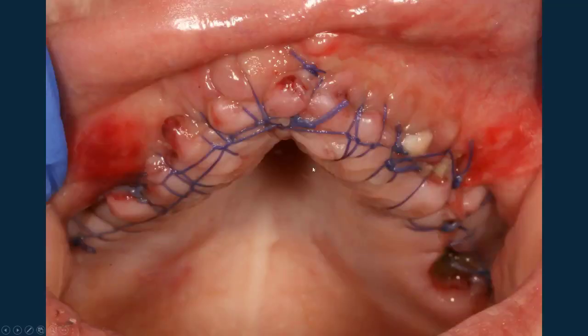So what Ben did is he went ahead and just closed up, and then since we had all of her digital data, we could just cut the teeth out of her intraoral scans and design some digital dentures. Teeth belong where they belong, and once we've done that setup relative to her intraoral scans and the facial scan, the difference between doing a wax up for crown and bridge versus a full arch wax up for an implant rehab or a digital denture is the same. It's just that for the latter, I'll cut the teeth out of the intraoral scan.